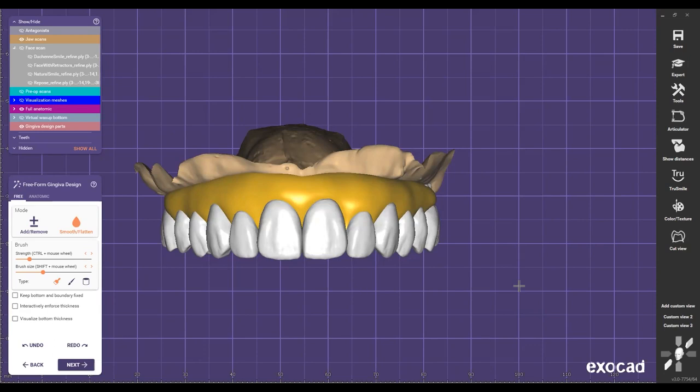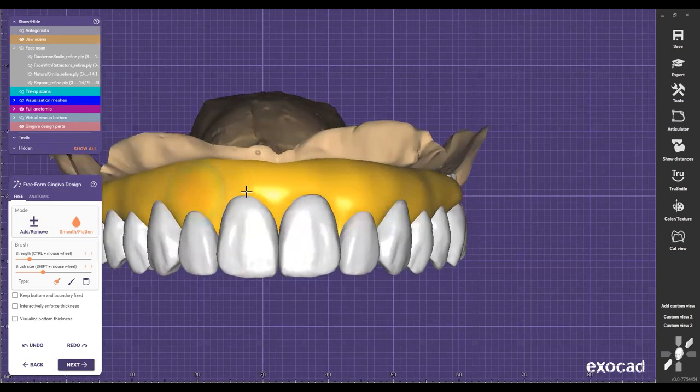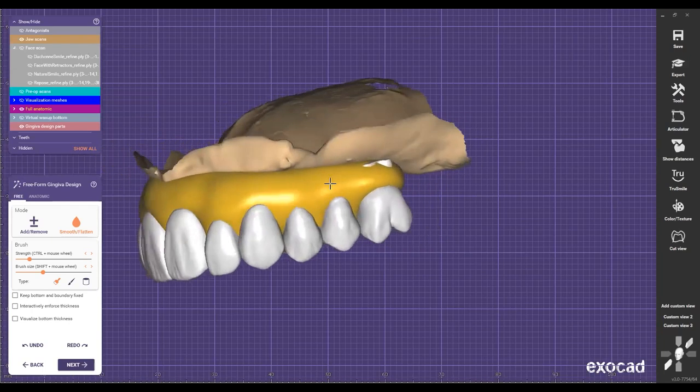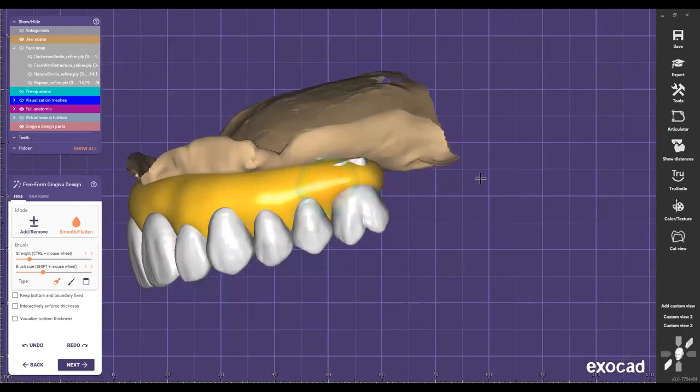And I say, okay, in the CBCT, I have the STL, and I can say, okay, you know what? I can go up to there, because sometimes we don't want to cut too much, right? We want to preserve bone as much as possible, and having the CBCT aligned here just gives us extra information there, okay? So from here, I'm going to leave it there because the neck is right there, but later I'm just going to start pulling those areas so that I can get a nice ideal position of this.